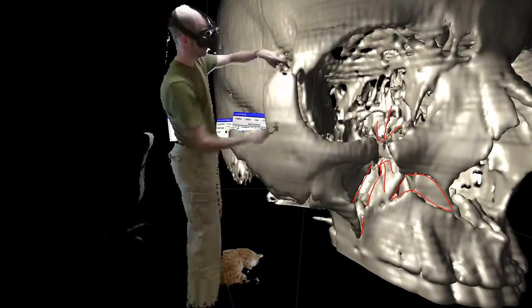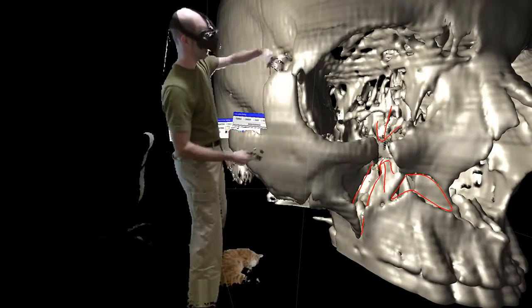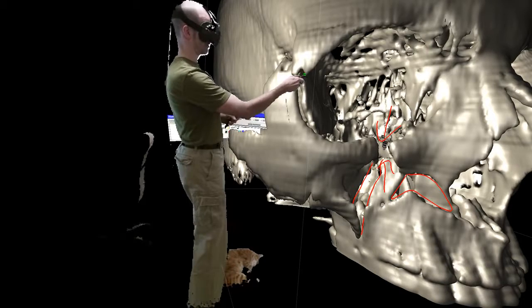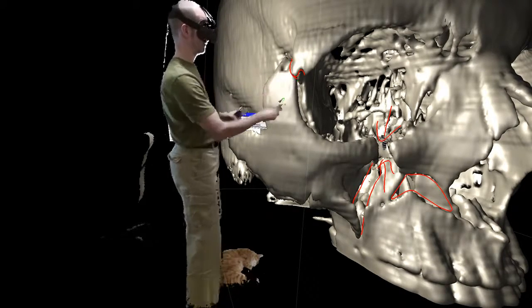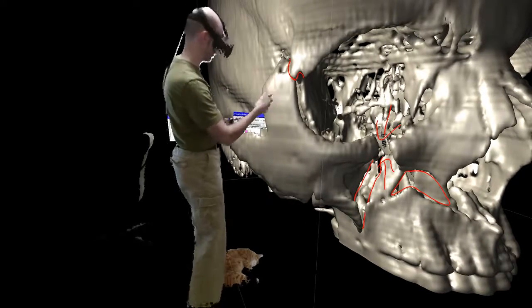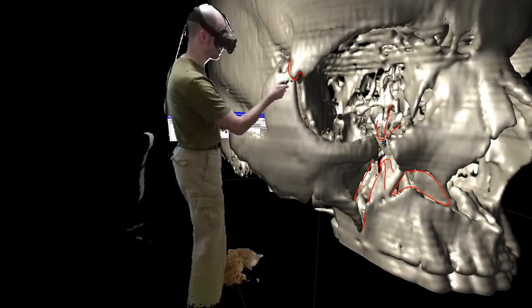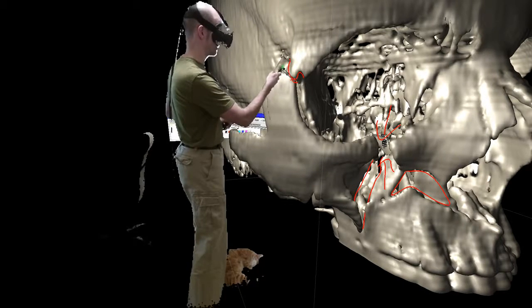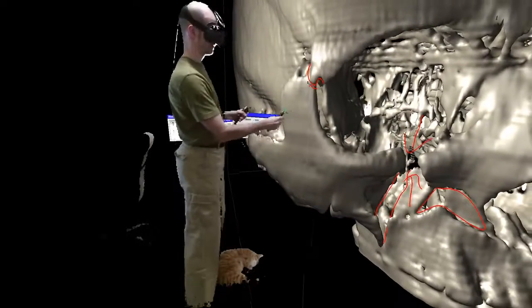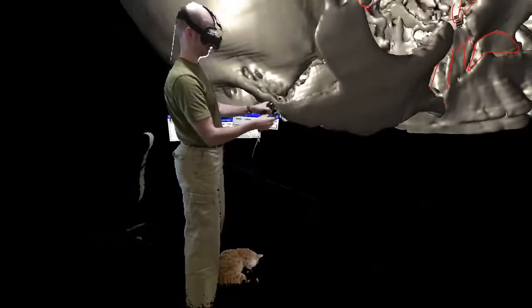So this part of the bone is supposed to go into this hole here. So we have this fracture going on this way, or thereabouts. If I measure displacement up here, then this turns out to be approximately 5.7 millimeters. And then as we go over here, we can look at the cheekbone.